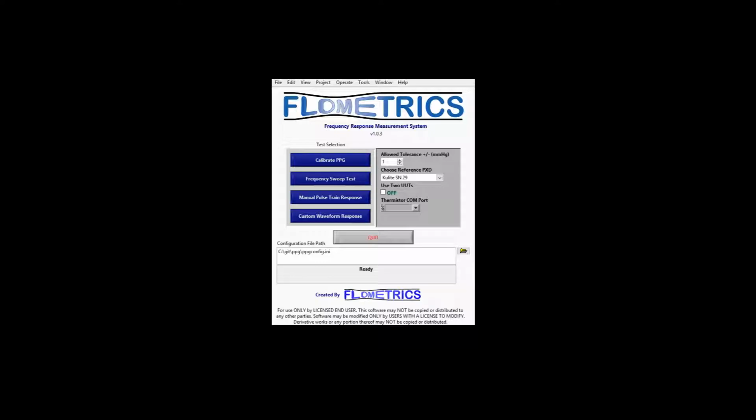Every time the FRMS software is started, a small amount of configuration is necessary to set up some of the global configuration items. On the right-hand side of the home screen, ensure that the allowed tolerance value is within acceptable range. This tolerance determines how closely the reference and UUT calibrations must match. For most purposes, 1 mm mercury is a good value.